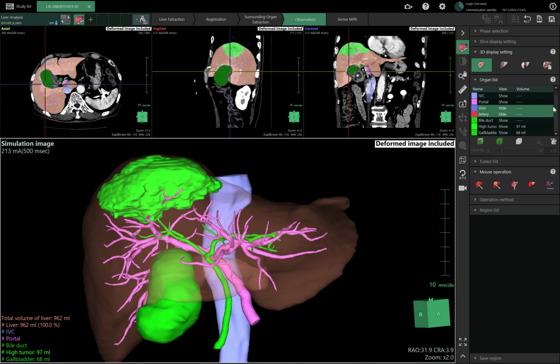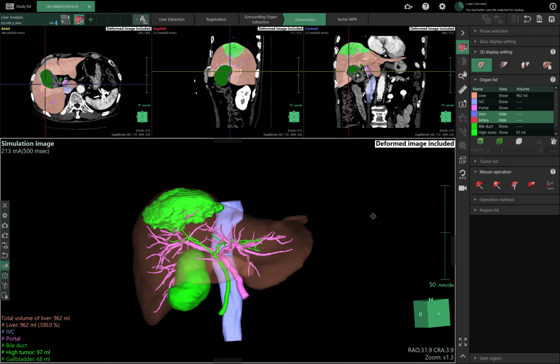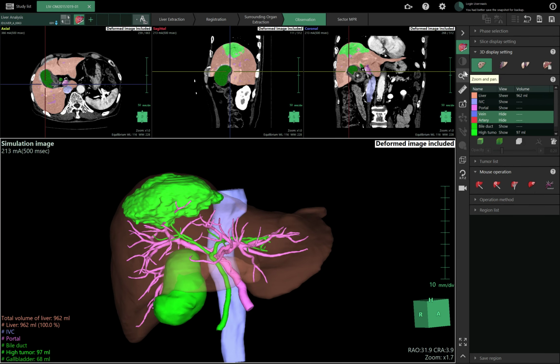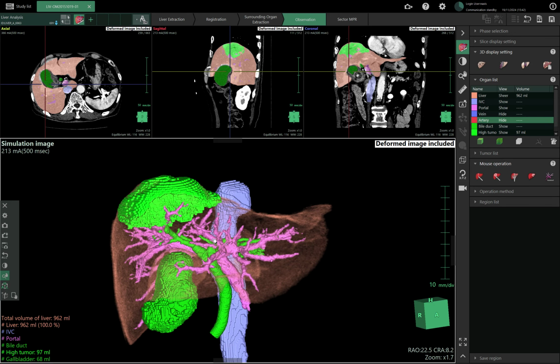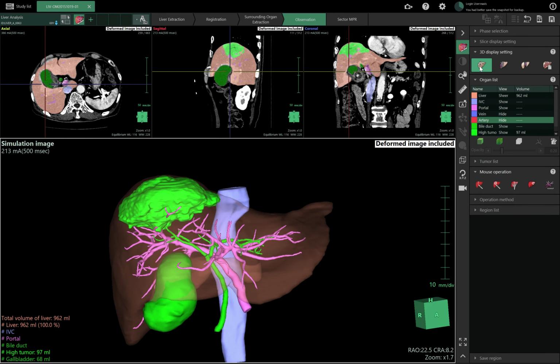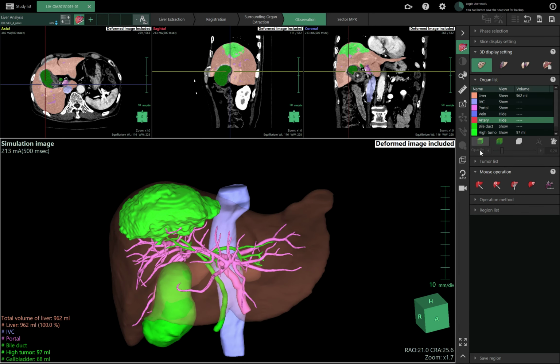Okay, here, as happened with the lung, we will have the possibility of the visualization of the surface display, or just the extraction. So we will have the visualization of the voxels, squares here, nothing that any doctor would like. The surface display, the cut plane, we'll come back to this later, and also the observation of the plane around the region of the cut plane. But here, the extractions will be slightly different from the lung. Basically, it's the same.